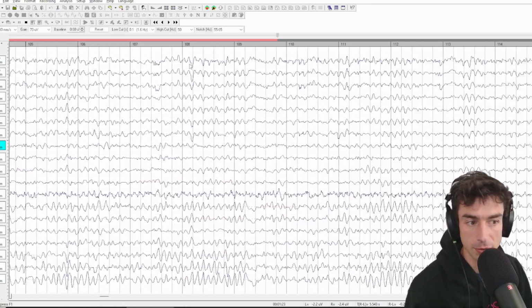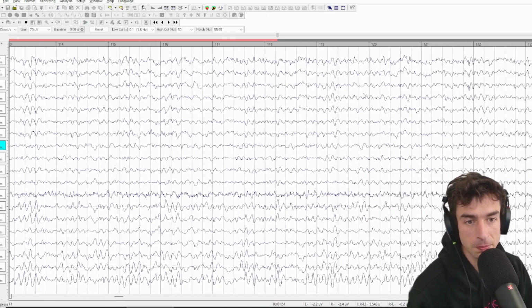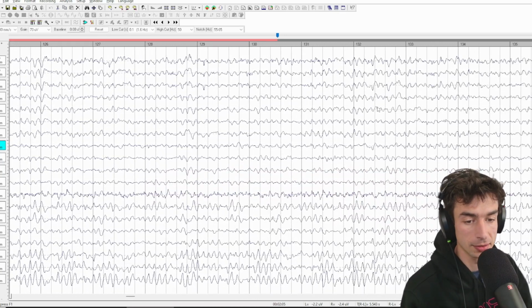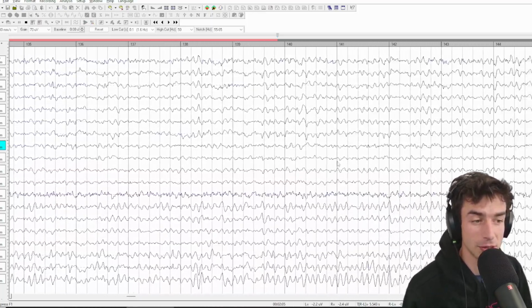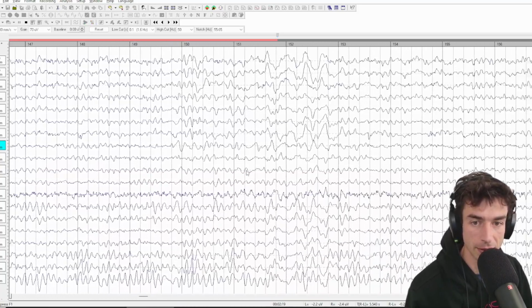So this is not a profoundly sleepy EEG, in that we're still seeing predominantly an alpha state, alpha stage of sleep, and we're already 2 minutes in. Sometimes if people are super sleep deprived, we'll have already seen a full dropout, and even in a future episode, I'll show you an EEG where a person is already having vertex activity just a minute or two in.